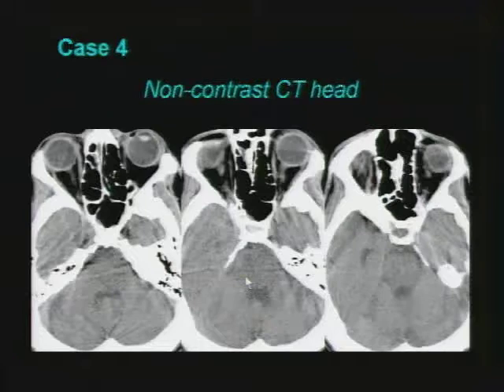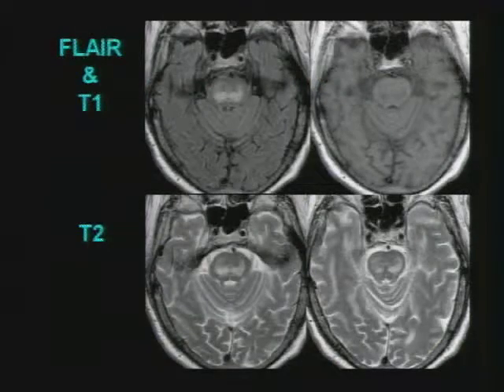It can be very, very subtle on CT, and I would not fault most people for missing this on a CT. Extremely difficult diagnosis to make on CT. But most of these patients usually go to MR anyway because they present with this rapidly declining mental status. They'll have a CT that looks kind of normal and they will go to MR.